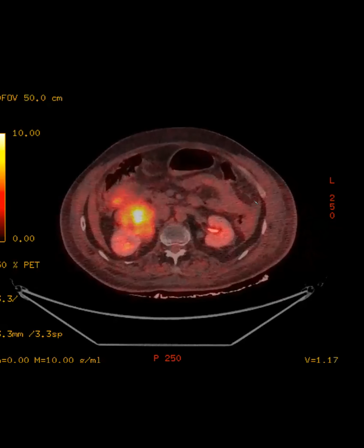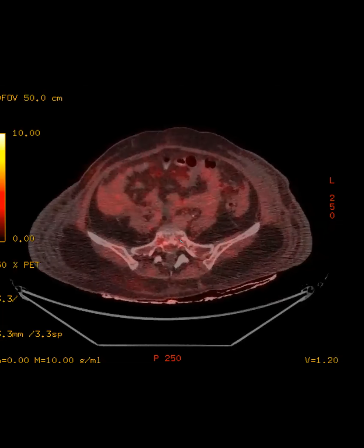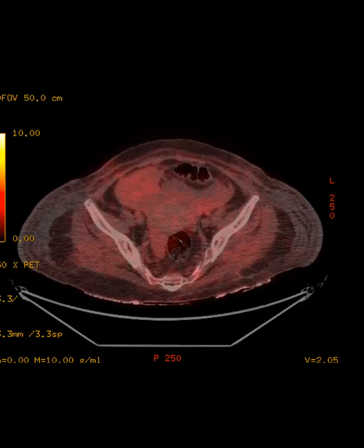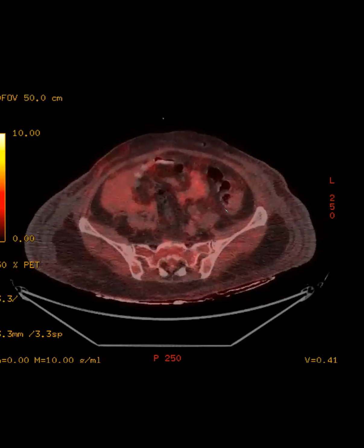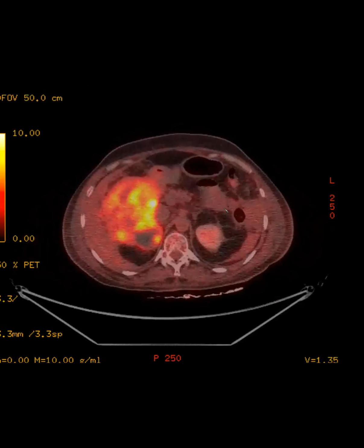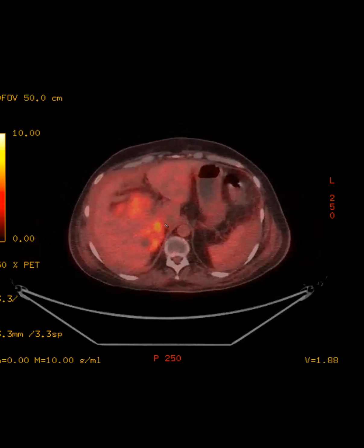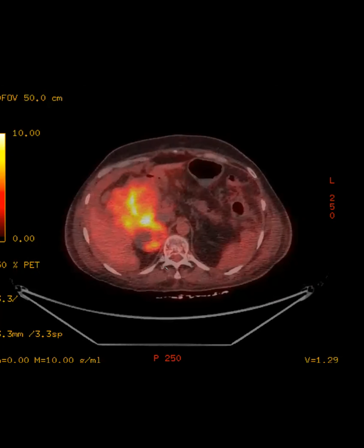And then there was this homogeneous avidity of the peritoneal fluid, which our nuclear medicine colleague said is basically a 50-50 chance of being malignant ascites. So they also hedged on it and said it was about 50-50. The surgeon kept asking us, do you think this is peritoneal disease? Even that little nodule behind the liver was not very avid, but we said based on the MR, we still thought it was.